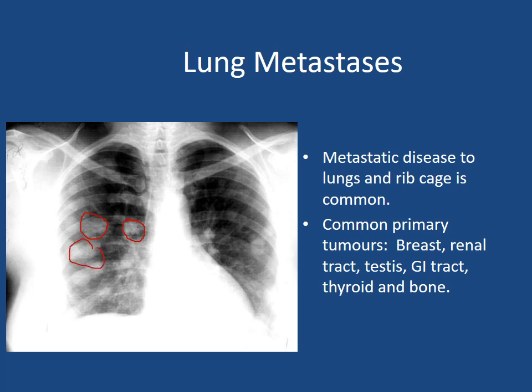Where you get very rounded metastatic deposits, they often get described as being cannonball metastases because they're very rounded and appear like, if you like, cannonball shapes. So within the lung here, we can see multiple dense deposits. And this is an example of what you see when you have what's called lung metastases, these secondary tumour deposits within the lungs.